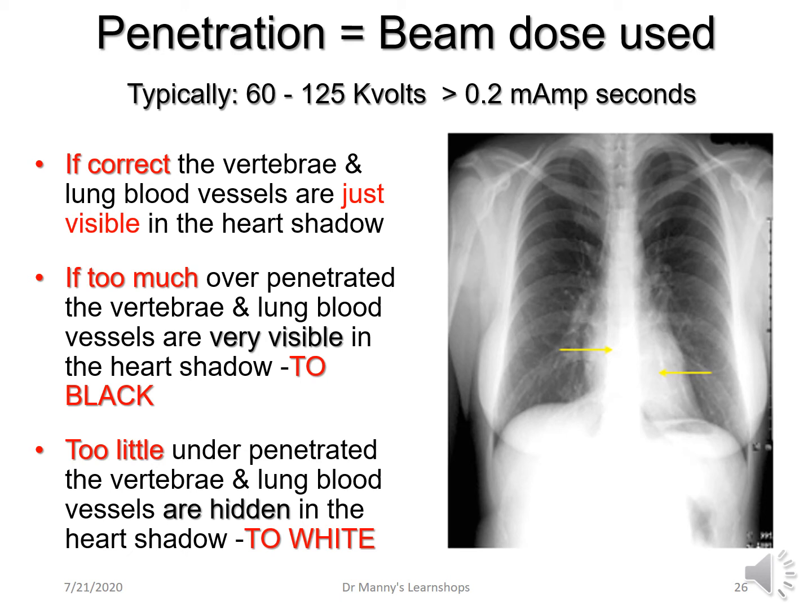Is this important? Well, it sort of is really if you're looking at the chest X-ray, because you want to have an idea, because this will be documented on the X-ray film, what the radiographer used. They will be documenting, for example, here that they use 60 kilovolts at a speed of 0.2 milliamp seconds.